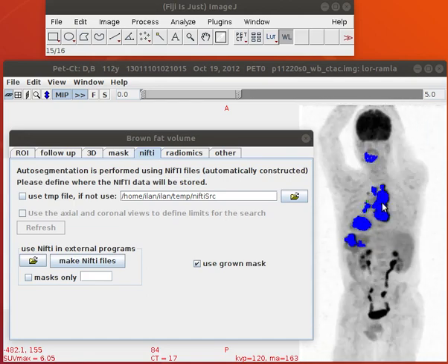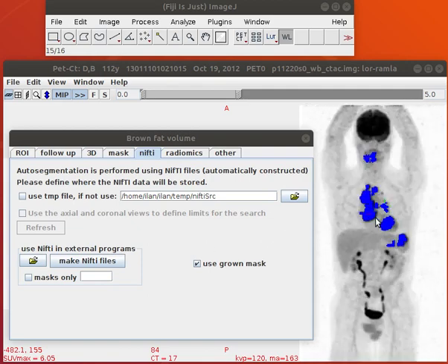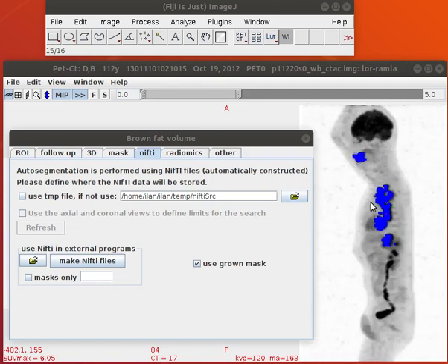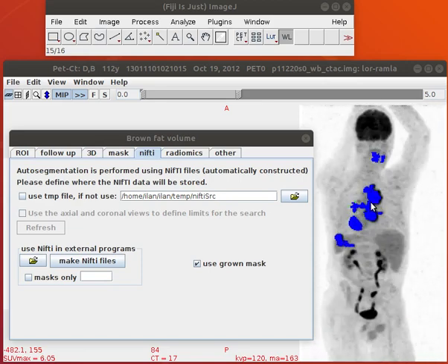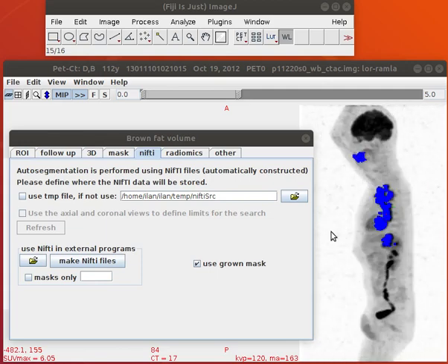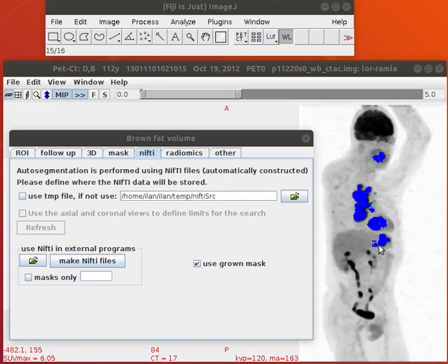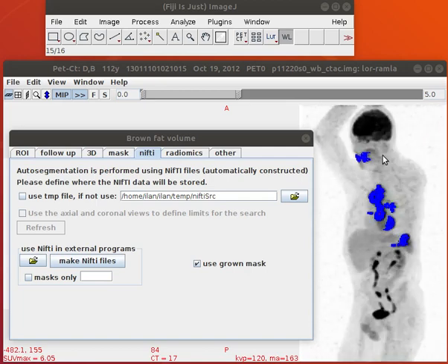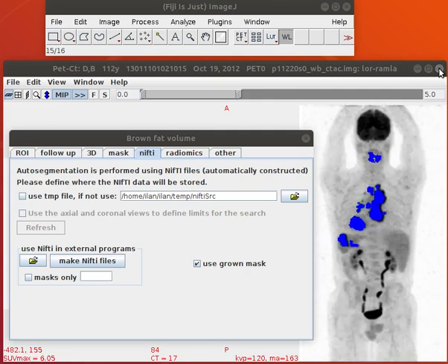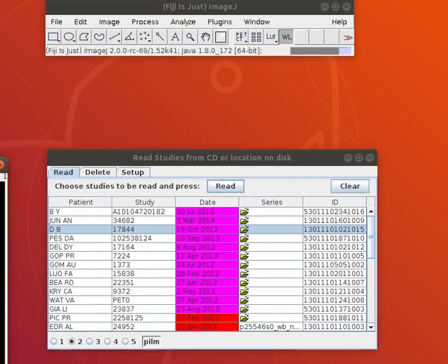And we can either do it online immediately after generating these tumor images, or we can do it later on. And I'll take the case of doing it later on. So suppose we've already done this part, we're not interested in it at the moment, and we want to start from the beginning and take data which we've analyzed previously and now generate external Nifty files.